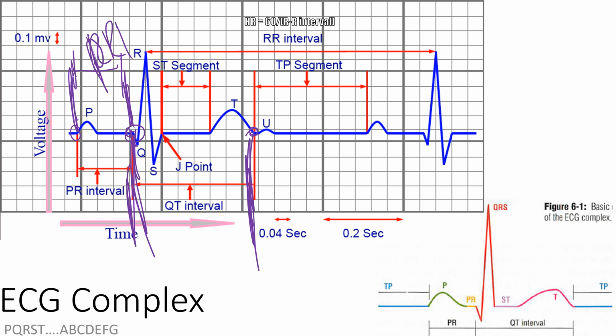So sometimes there's not even a Q wave on certain QRS complexes. So yeah, it is a little bit finicky. But it's to the start of the QRS complex, and it's not halfway through, it's isoelectric to isoelectric, just before it lifts off or just before it goes down for a Q wave, for instance.